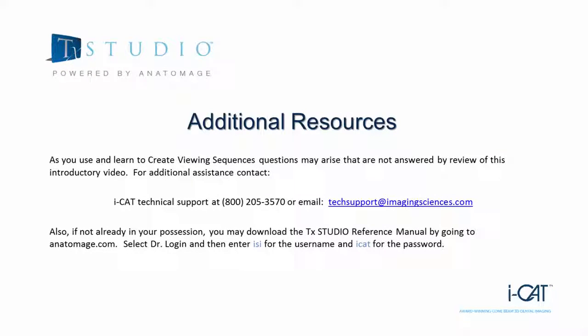This now completes our Creating Viewing Sequences and 3D Videos training tutorial. Hopefully what was covered today will be beneficial as you treatment plan with your patients and share with your colleagues.